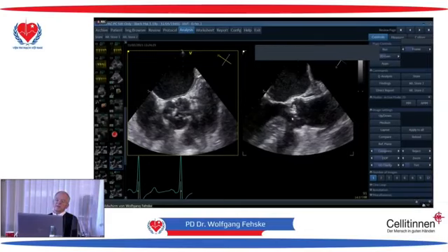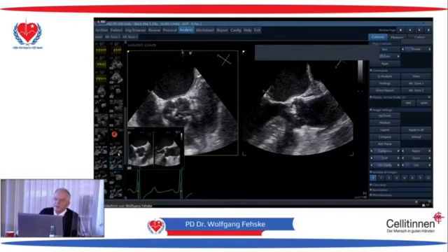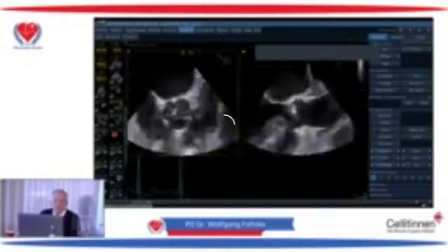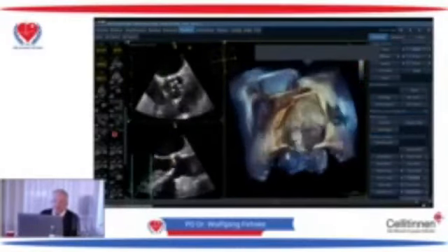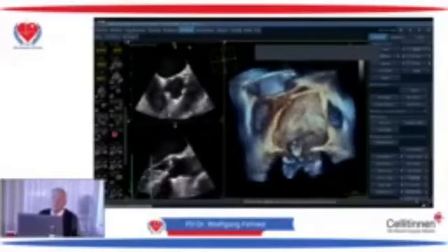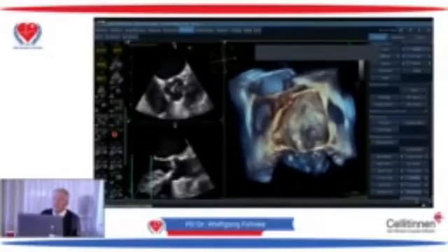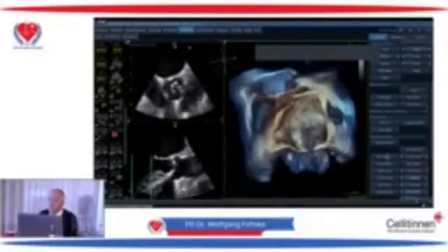We cannot. Also, we declare where the calcium is, and we explain it to my surgeons. And this is for any TAVI. I will just show you again how we do it. I understand your question. Of course, I do not quantify it, but I explain that this is a tricuspid valve, and then we go through it as the CT does it.